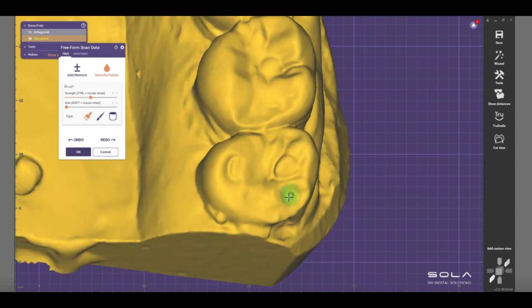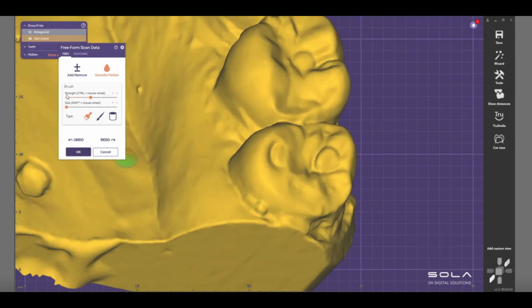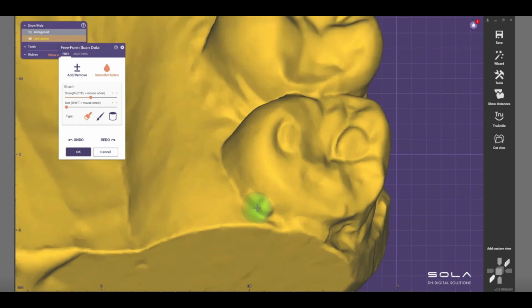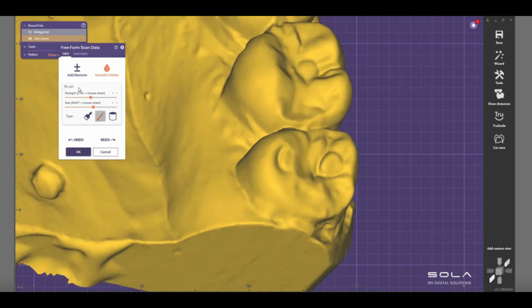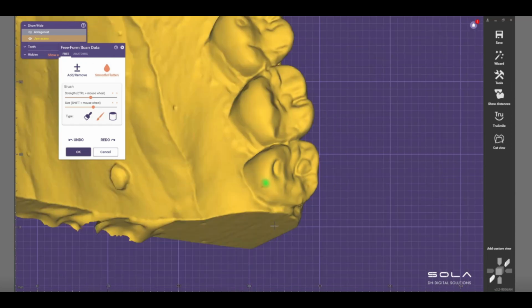Shift will flatten out. I'm just using smooth. I'm not shifting because shift will give you a flat. So you can use whatever you like. You can use the brush, but there I'm only using this one, you can go here, that'll be bigger, and I can use this one, and then again smooth. So it all depends what you want to use. If you want to carve in, you can go to remove, and you can carve and remove that area there. So smooth those areas.